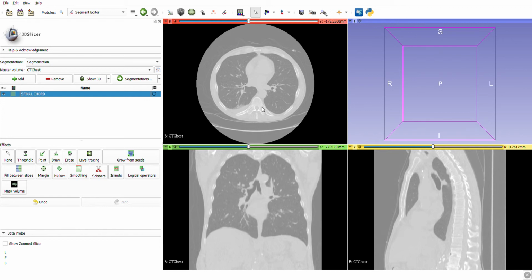These colors are by default given by the software for the different parts. As you can see over here, tissue is there, artery is there, body fat is there, bone is there, but you also have the option to customize, just like whatever I am doing. So for easiness, in order to identify the different parts, I am choosing this red color. I will click on select. As soon as I click on select, as you can see over here, besides the spinal cord, red color has been highlighted. Now we are going to start the process of separation.